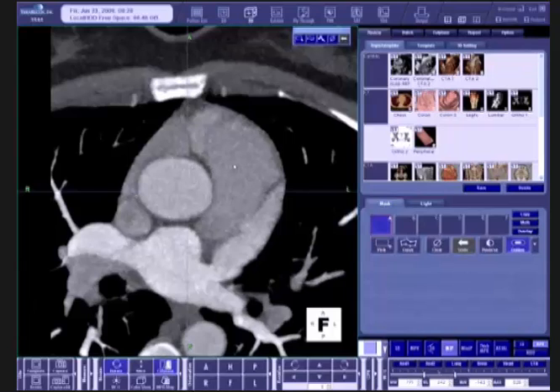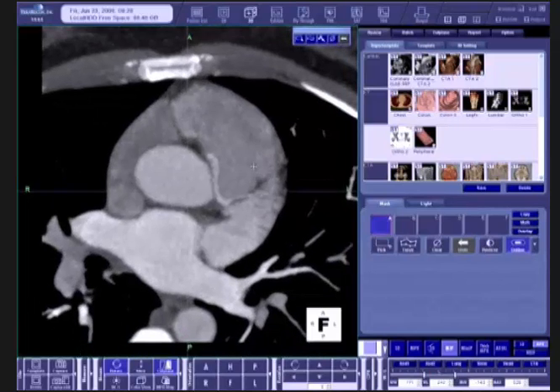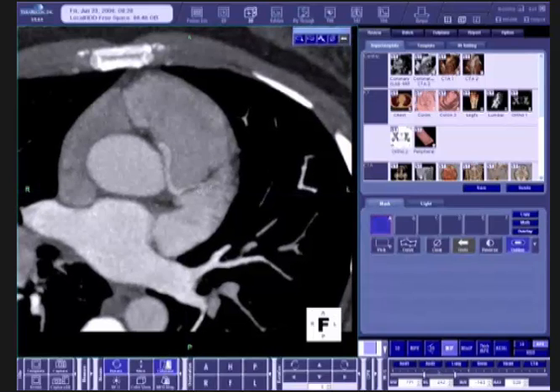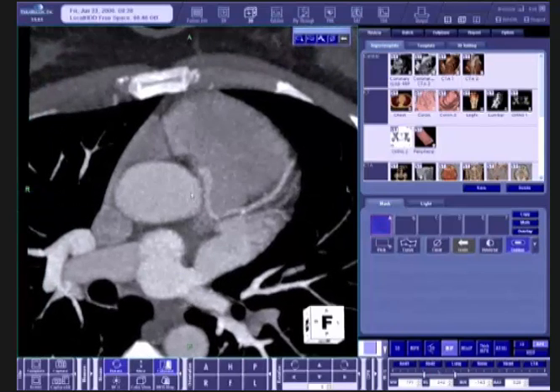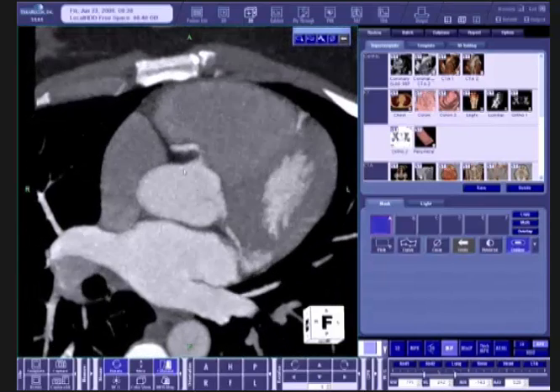Again, we're here at the aortic root, and we're going to move down into a region that we would anticipate would be the left main coronary artery. And I notice a situation where I see a vessel or an opacification in this region, and then as I proceed down this direction, I can see that this becomes the left anterior descending. In this case, the left main coronary does not come off in the right situation.